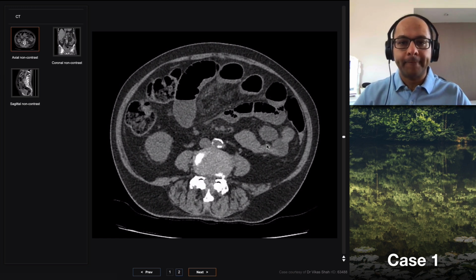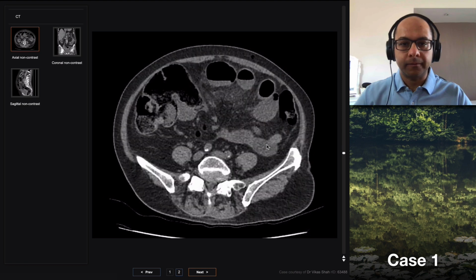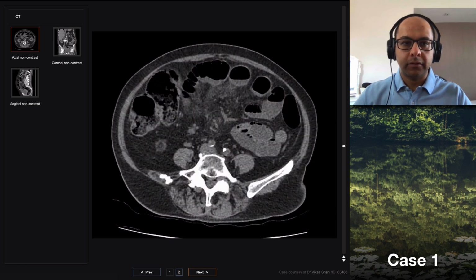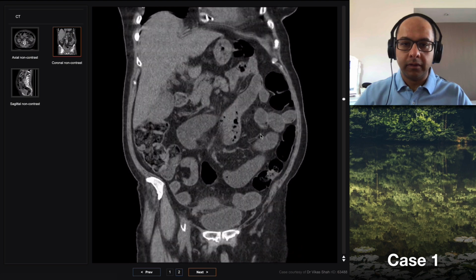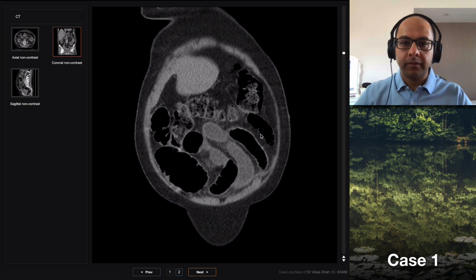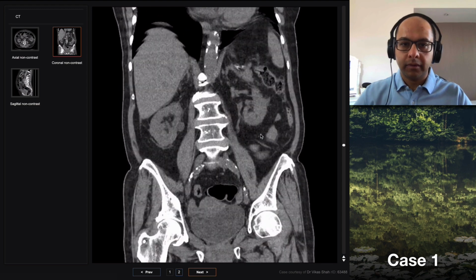The pattern is more fitting with a venous etiology because of the wet mesentery. The hyperdense wall is probably representative of some hemorrhage in the mucosal wall. So if there was contrast available, I'd be looking for SMV thrombosis and things like that. So in summary, I think this patient has bowel ischemia of the small bowel.